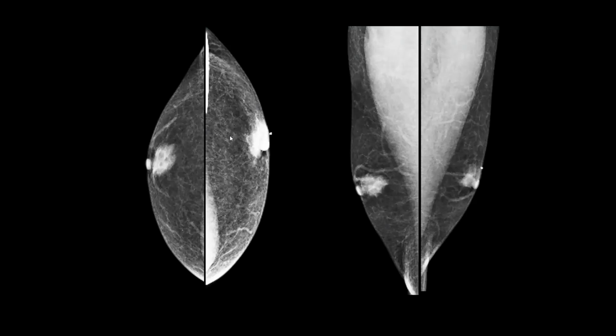So normally what I do, if a patient is over 25 with gynecomastia, you start with a mammogram. And really gynecomastia is a mammographic diagnosis, and you don't have to do the ultrasound. You want to just spot the palpable area, which we did, to make sure there's no underlying mass, and there isn't. And the scary thing about gynecomastia is it looks irregular, it's flame-shaped, but it's retroareolar. You want to make sure it's central to the nipple.